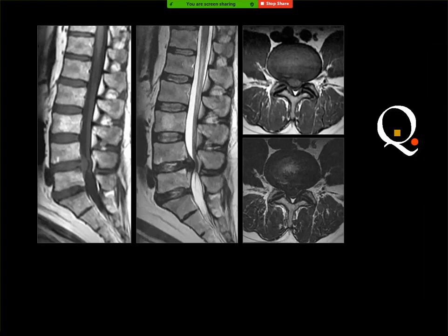Disc herniation. Yeah. MRI T1 sagittal, T2 sagittal. Yeah. T2 axial. T1 axial cuts. T2 axial. Yeah, T2 axial. L45 disc herniation. Yes. To which side, left or right? Central, right side. It is more paracentral.